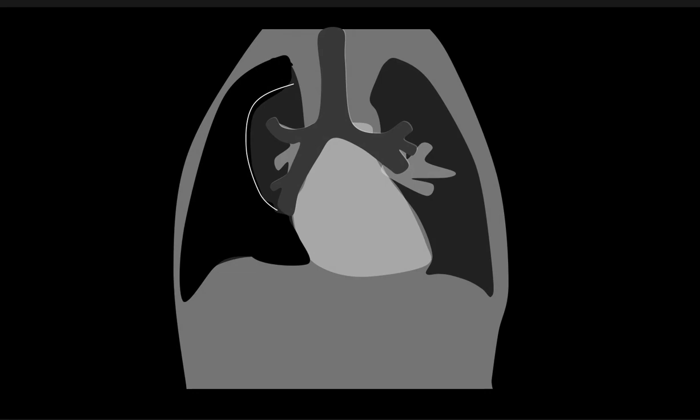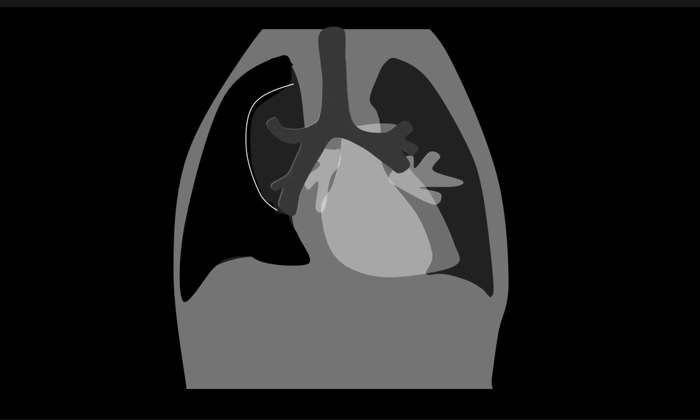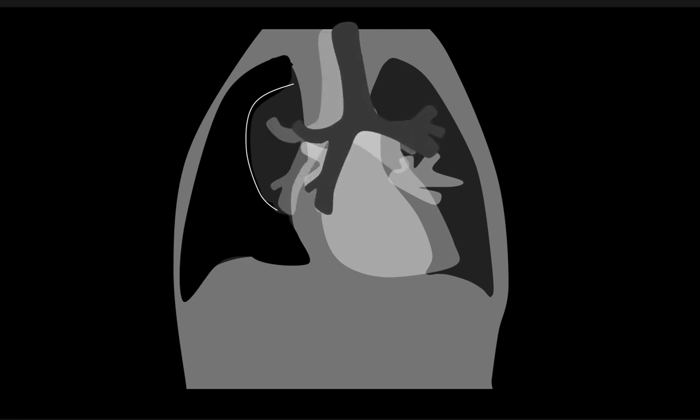There are a couple of findings that you have to look for when you've got any pneumothorax, but especially a large one. Shift of the heart and mediastinum, shift of the trachea. And I'll point out that two of the cardinal features, especially sometimes in the supine study, you may not see that. Instead, you want to look for this right here. If you see depression of the diaphragm, that is happening because there's extra pressure there. So not just pushing the heart and the trachea over, it's also smashing that diaphragm down. So that, again, can be a key.